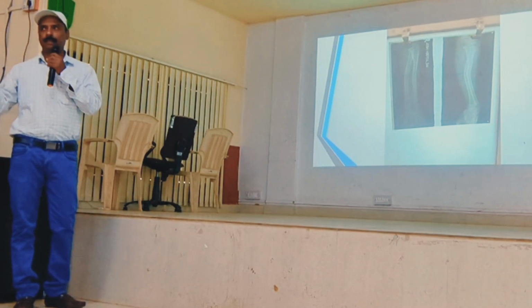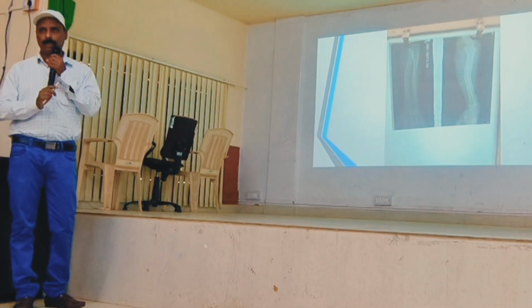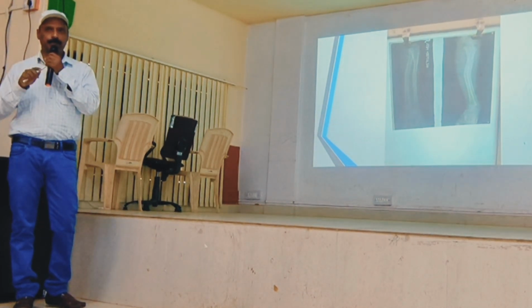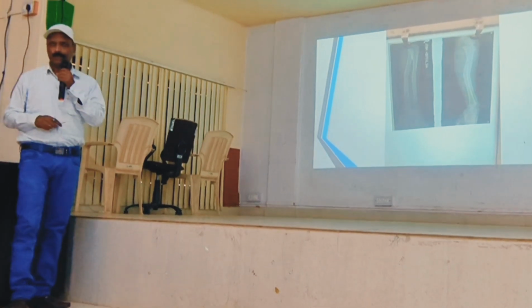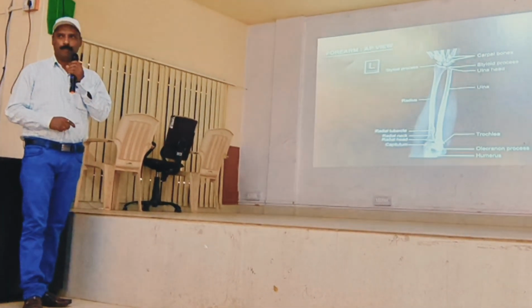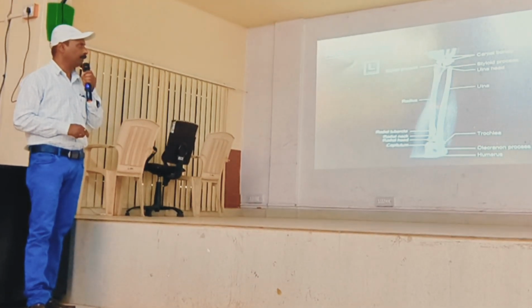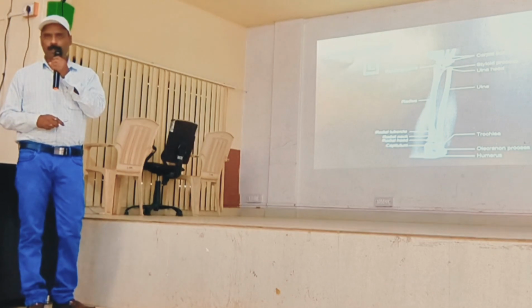You will get these in your clinic from patients in two views, simultaneously printed on one film or one paper. So this is what you can read. You have to see the previous X-ray, what was shown, all those regions, but here I have told you the shaft fracture of the radius and ulna.